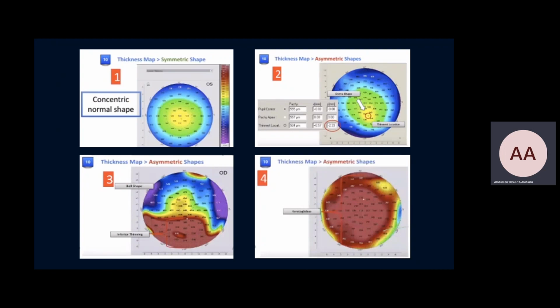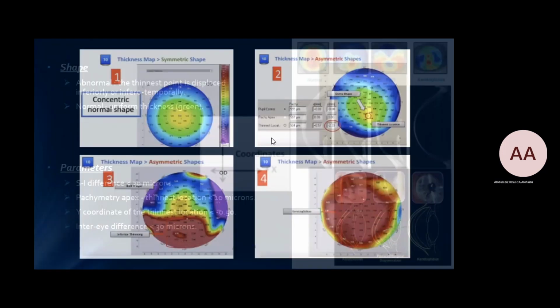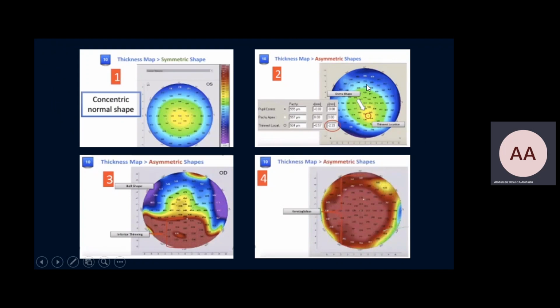Could you point at an X and Y axis? Yeah. These are very important. Go to the XY in the table. If you can see, X means the X axis, so right and left deviation, plus to the right, minus to the left.